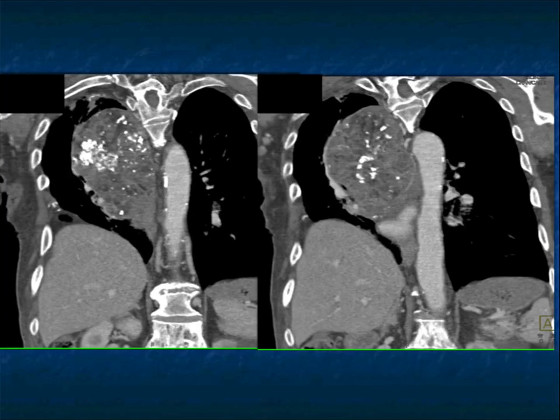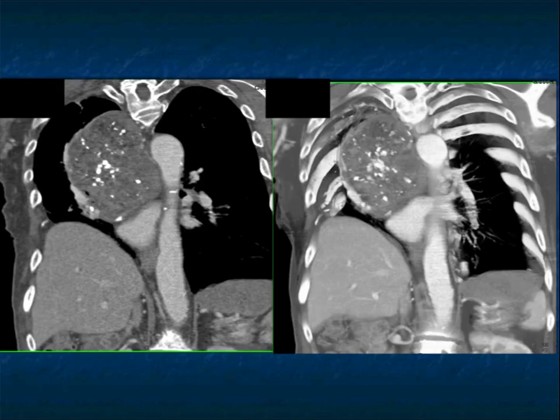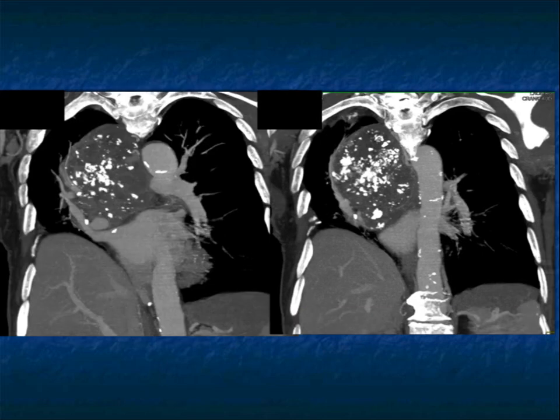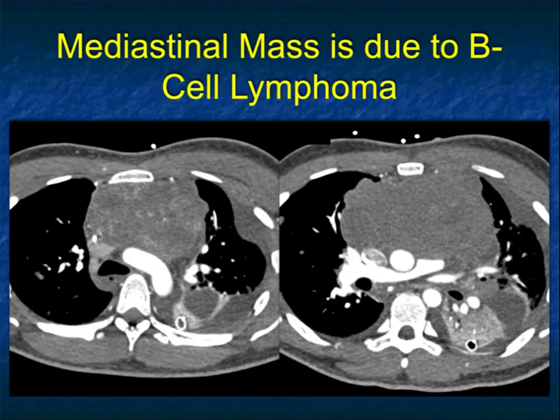But I think at the end of the day, in the mediastinum, large soft tissue masses with fat, obviously, it's easier. But not every teratoma has significant fat. This has very subtle fat, but the calcifications are indeed very, very impressive. And this is just a really nice example of a teratoma. And here's just a few more views of that. And I really did like this case, obviously.